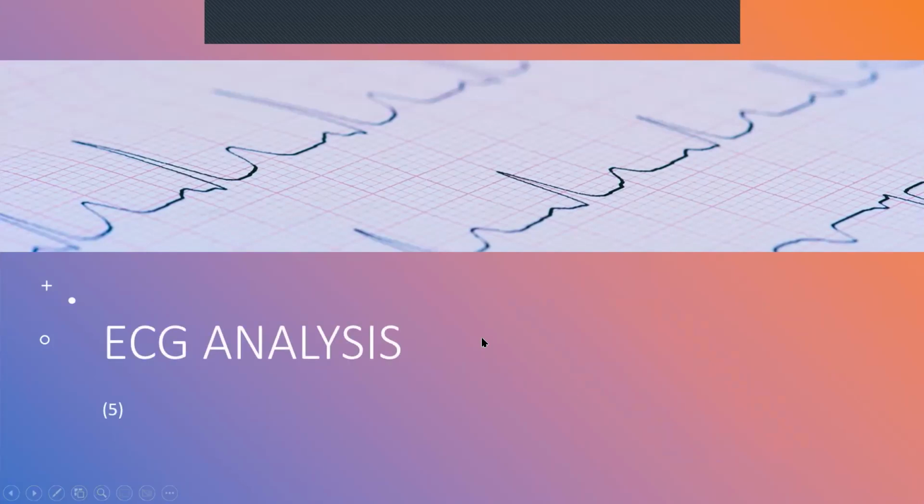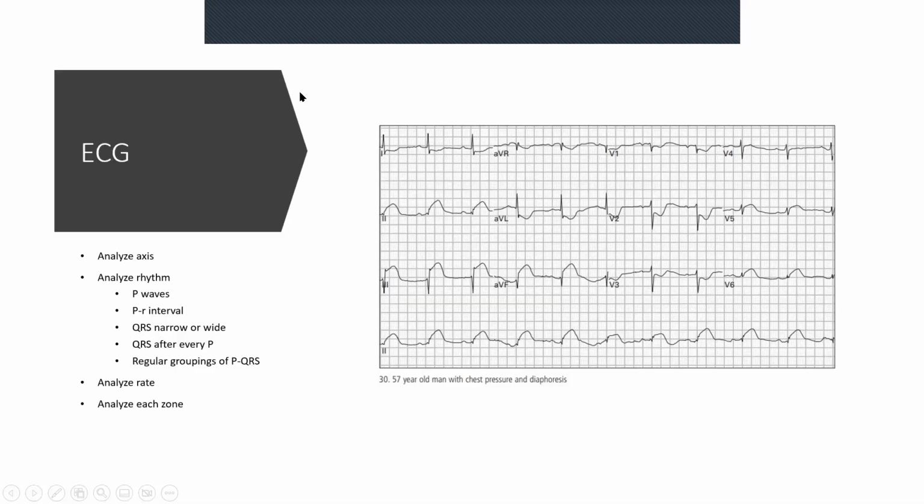I am recording this as well. So we haven't done a new ECG in quite some time. So I was hoping we could just start off with maybe a slightly, not simple one, but maybe just whet our appetites for what may come in the next month or two, and just as we carry on learning. For those of you who have been following for quite some time, you'll probably be able to pick it up quite easily and find the answers quite quickly. But in any case, let's start.